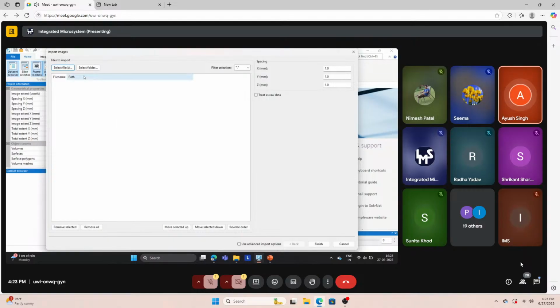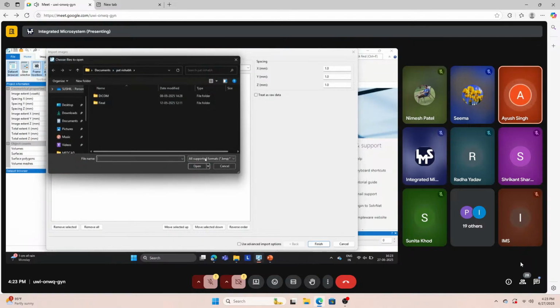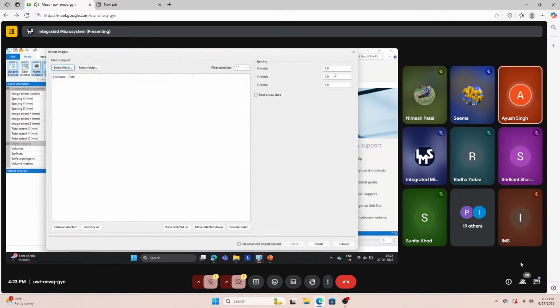Now coming on to the best part, this is the raw images support. So you can see there are a large number of image modalities that we support like BMP, JPG, then TIFF, raw image, volume image, and any format that we need to work on. We can do that over here.